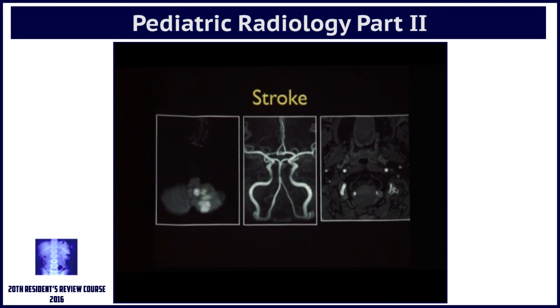Why am I seeing a hematoma on this TOF image? Because basically a TOF image is a T1 weighted image, and I'm going to see subacute blood in that. So I'm seeing flowing blood as bright because it's TOF after all, and I'm seeing subacute hematoma as bright because that's what it's supposed to look like on T1.